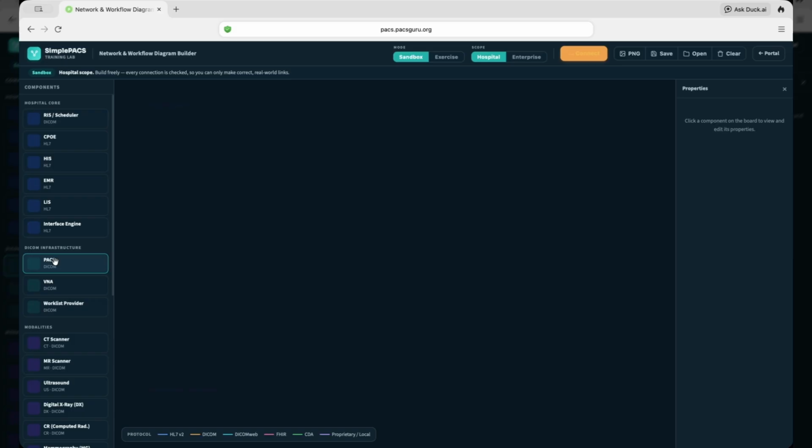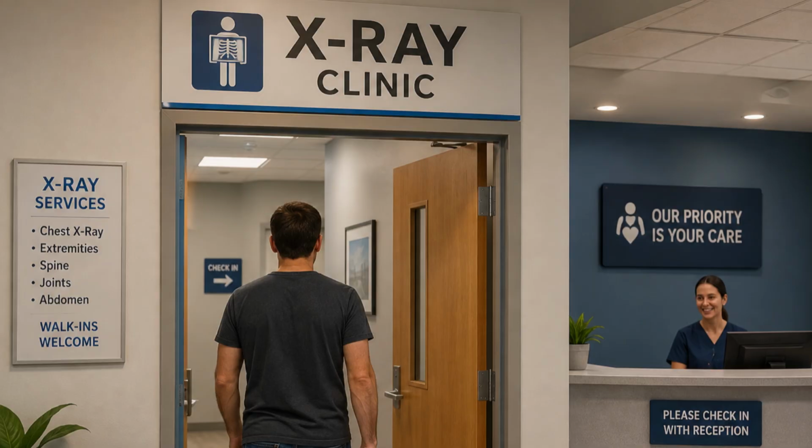In this video, what I'm going to do is build out the legacy network configuration using our training labs network workflow diagram builder. So let's do just that. Let's look at a situation where we have a patient walking into a clinic.